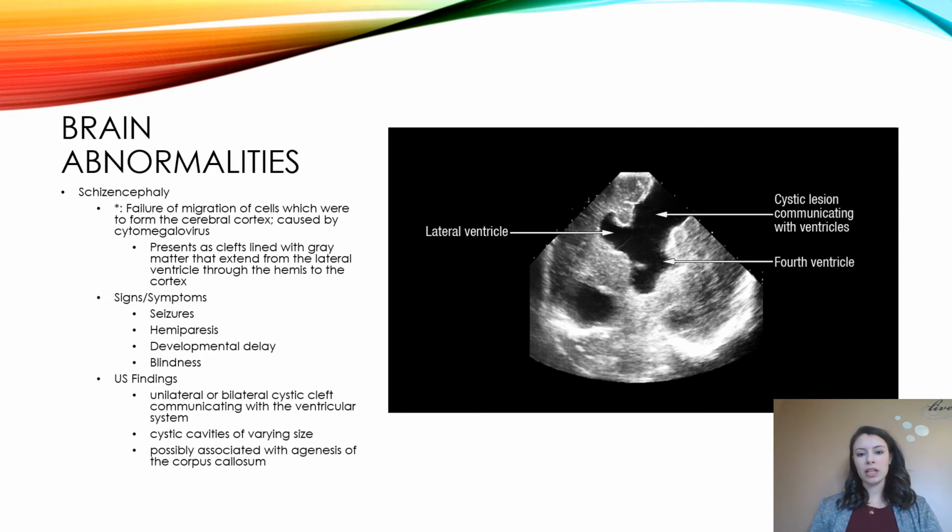So if we look over here at this picture, we can see here's a lateral ventricle, and this is the whole cystic communication between the ventricles, and that's not supposed to be there.